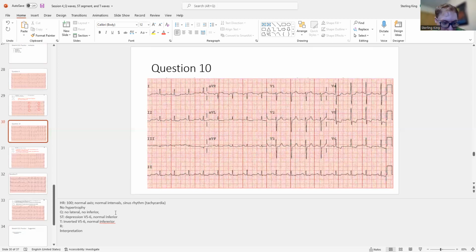Coming back to that. So let's do our precordials. Looking for our Qs. There's an R. There's an R. It's getting bigger, bigger, bigger, bigger. So no Qs, and there's good R wave progression.